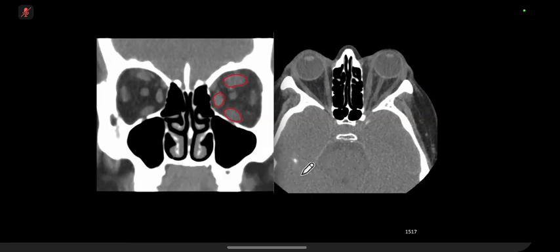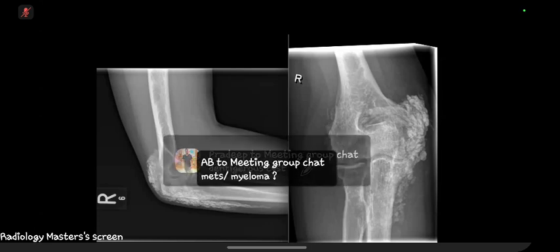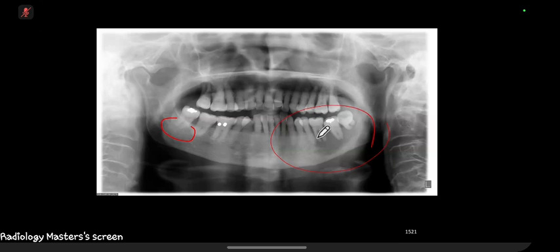Destructive lesion in the jaw. This is due to malignant destruction due to a renal cell carcinoma. This is permeative. Okay, if it was a dentigerous cyst, it would be fairly well defined. But this is all irregular.